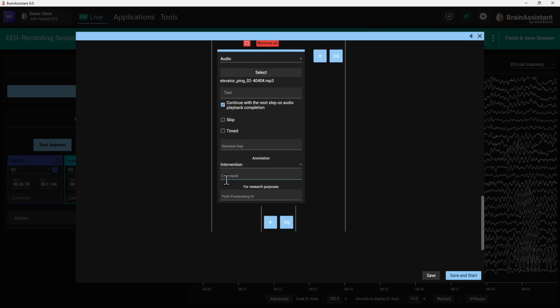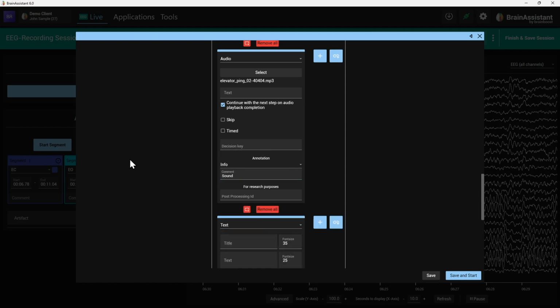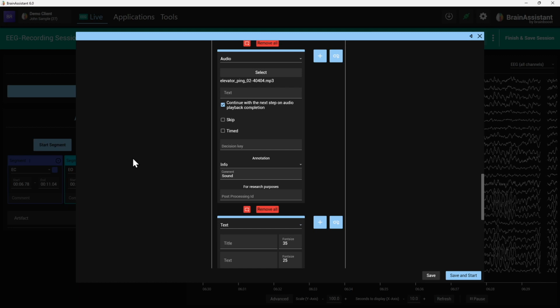So this is fine. It will not be an intervention. It will be info, and it can be info, sound, whatever. I kind of like to do comments, so afterwards it might get messy, so just be sure to label your data. Plus, now we have a welcome dialog, eyes open, eyes closed, and a sound.